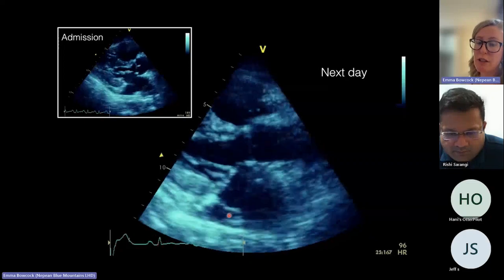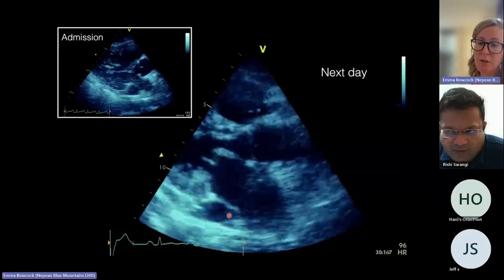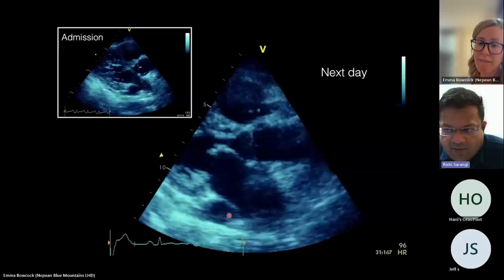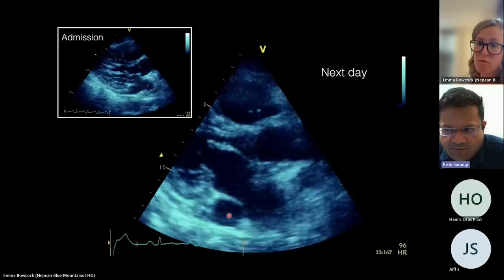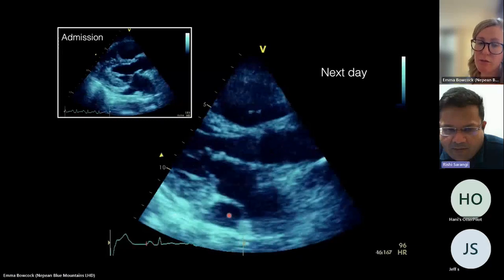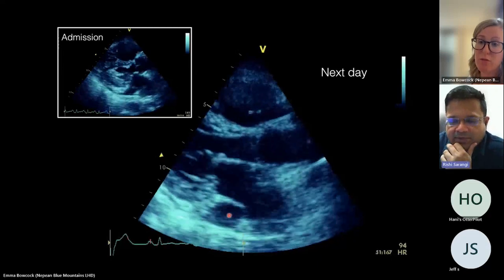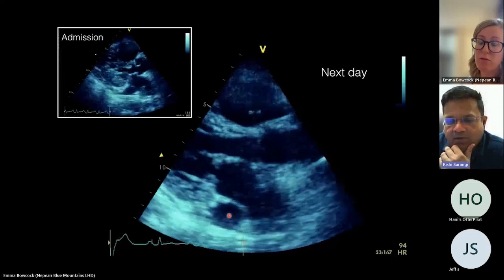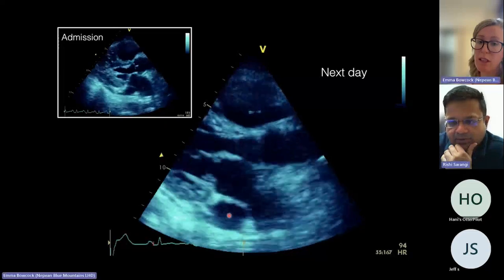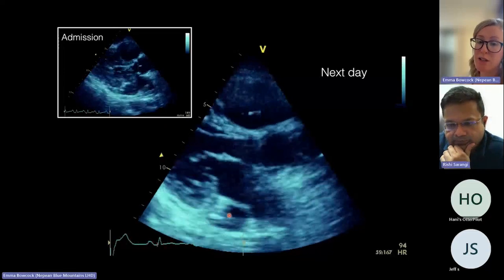So what things might you think about this dilated coronary sinus, Rishi, just as a side point? What could be causing that? Raised right atrial pressures. Yeah, from what reason? Just filling back pressures and increased right ventricular pressure overload. Yeah, severe. So sometimes you see it in severe chronic pulmonary hypertension patients, don't you?